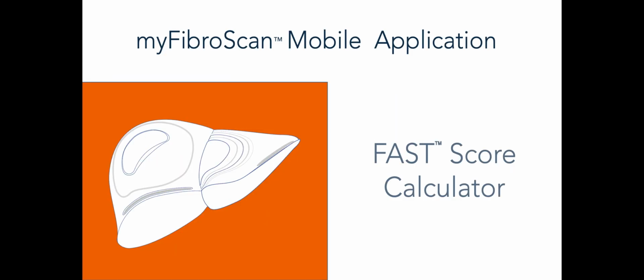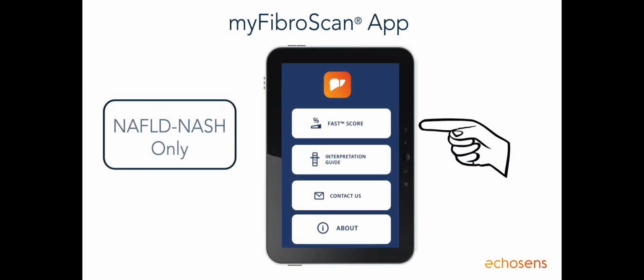Now let's turn to the second function within the myFibroScan app, the FAST score calculator. To calculate the FAST score, you would merely press the FAST score icon, and please appreciate the FAST score is used only in suspected NAFLD-NASH patients. It is not applicable in any other liver disease. It has to be suspected NAFLD-NASH and a patient that received a FibroScan test.